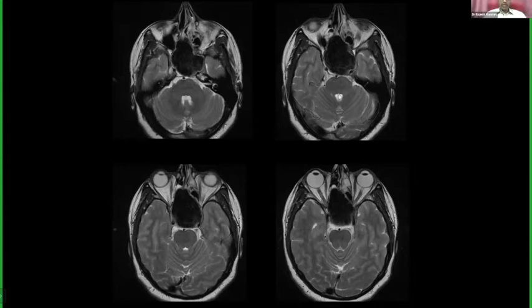Yeah, so you are discussing the lesions involving the sphenoid sinus. Here, in addition, the lesion appears very dark on this sequence. So, what does it indicate? What type of tissue are we dealing with? It can be a fungal component, sir, fungal hyphae. And it actually mimics air. It's very hypointense. Okay, what else?